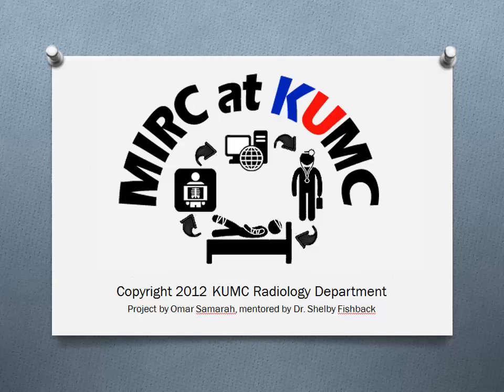Welcome to your first teaching file. The most basic teaching file consists of an image and some accompanying text. Students of radiology can learn from files as simple as this.